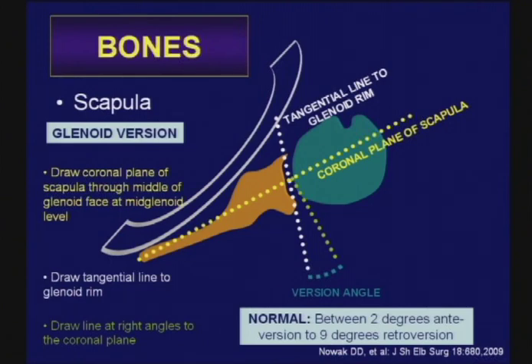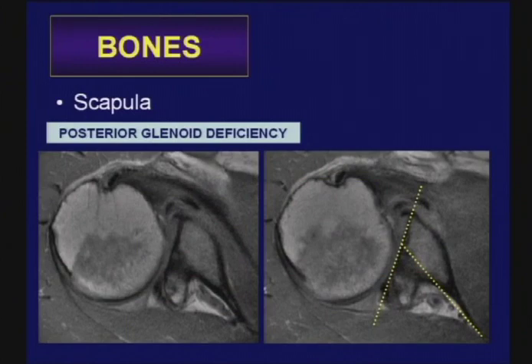However, having said how difficult it is, I would indicate that it does become useful, particularly in examples like this, where there is considerable joint disease, in this case osteoarthritis, and the orthopedic surgeon may be considering doing some sort of arthroplasty. Knowing the version of that glenoid face here retroverted, and other things such as the loss of bone stock of the scapula, and there are ways of accomplishing that as well, you're providing useful information to that orthopedic surgeon.